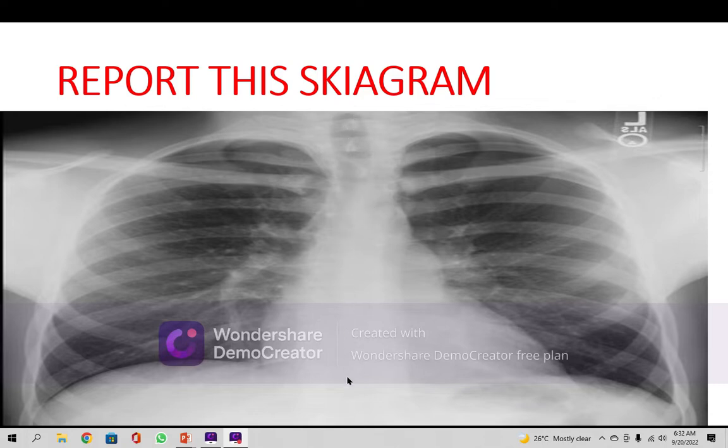Because of the scoliosis, he cannot stand in a straight line. It's difficult because it is moving like this. The spinous processes are visible here, which shows the scoliosis. Scoliosis means a lateral view is needed for kyphoscoliosis.